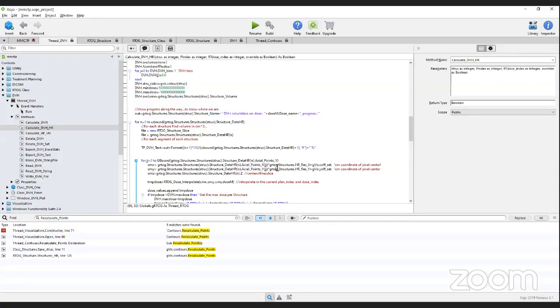Now that might take a long time to calculate. It also depends on what you're looking for, how accurate you want it to be. In a clinical situation, maybe it's not really important to calculate for a long time. You'll be happy with the higher uncertainties on this, or maybe not. So it depends on what your goal is. But I tend to agree with CT resolution. That should be probably the limiting factor.